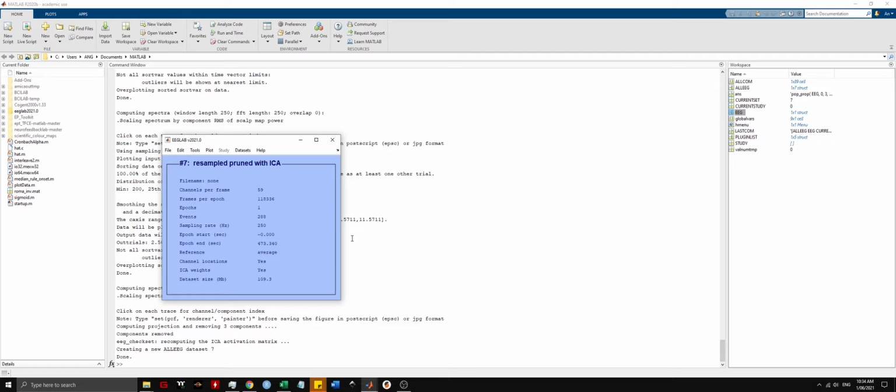And the next step is just to split the data into epoch segments. So when we're working with event-related potentials, that means we're interested in brain activity that's related to specific events, like the presentation of a stimulus. And we want to see whether that activity differs across experimental conditions.